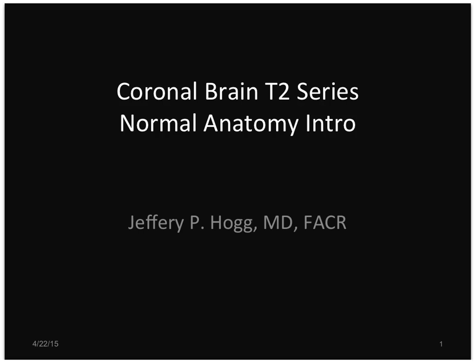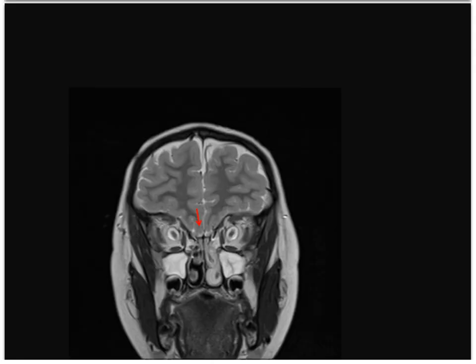This is an anatomy tutorial in an angled coronal plane using T2 weighted images. The gyrus rectus, olfactory bulbs, and orbital gyri are landmarks on the inferior portion of the anterior frontal lobes. We can see the second cranial nerve, or the optic nerve, surrounded by cerebrospinal fluid in the optic sheath.